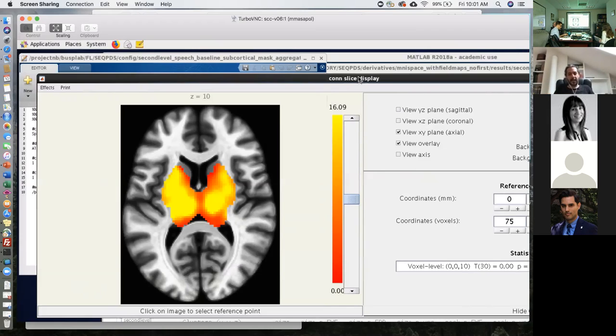In some particular cases, that might not be a good solution, but it's rather strange. It happens, for example, if you're using an experimental coil that gives you a very high signal-to-noise ratio in the borders of the brain compared to the center of the brain, and sometimes you get this masking that removes portions of the center of the brain. That's because the scanner itself didn't have much sensitivity, and it gives you lower average global signal values within those regions. So those are a little bit more of corner cases.